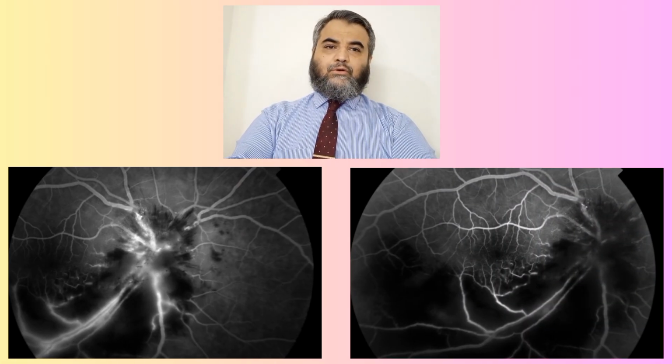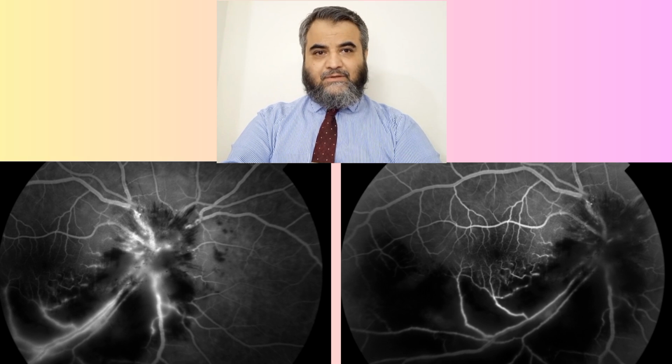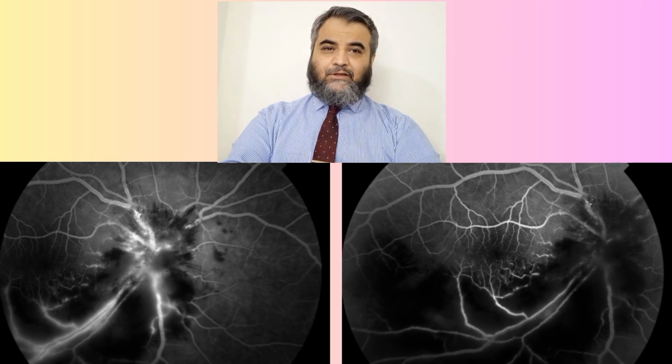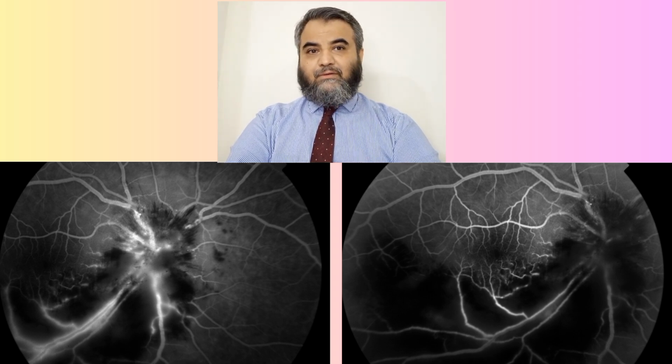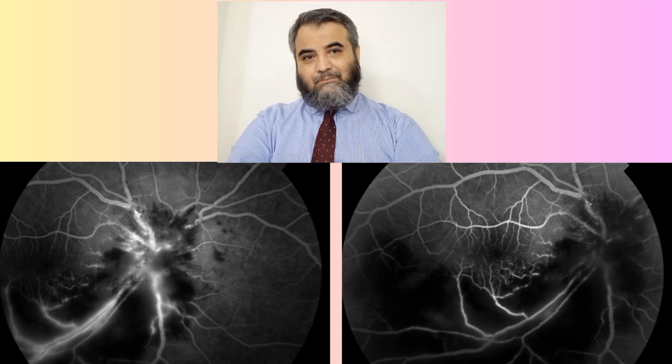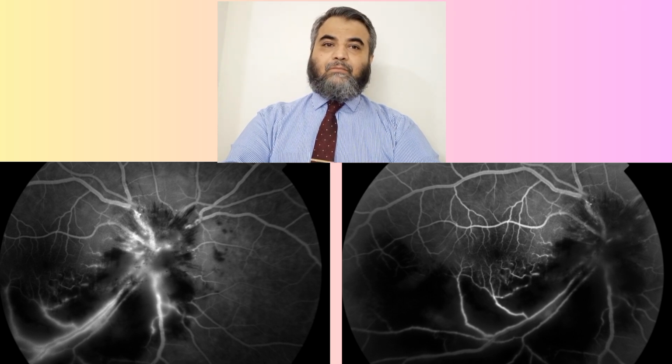In these patients we also go for fundus fluorescein angiography. The dye is injected, and then photographs of the fundus of the retina are taken. This is the arteriovenous phase. Here you can see hyperfluorescence along the blood vessels where the lesion is. Along with this, the darker, black areas are hypofluorescent because of blocked fluorescence due to hemorrhages. So the hemorrhages, number one, and number two, the vasculitis element, which is decreasing the perfusion, are both contributing to the hypofluorescence.